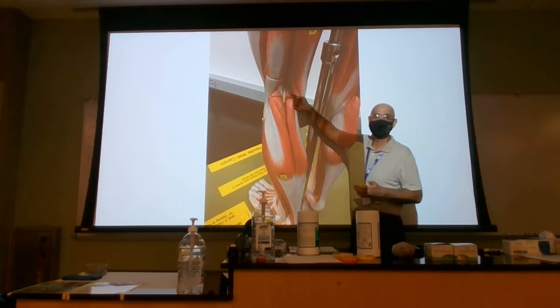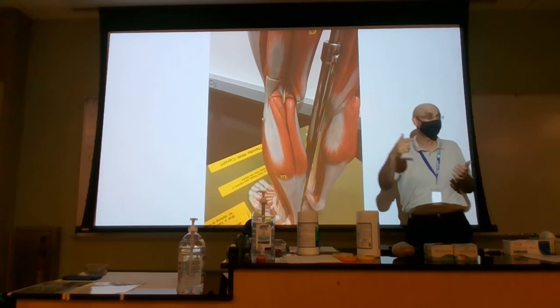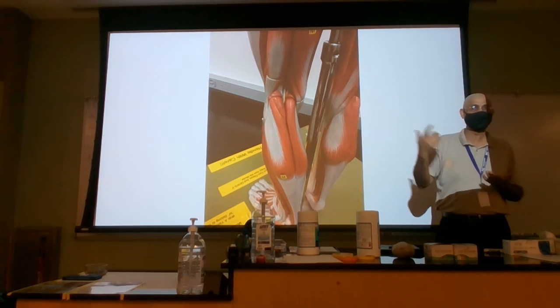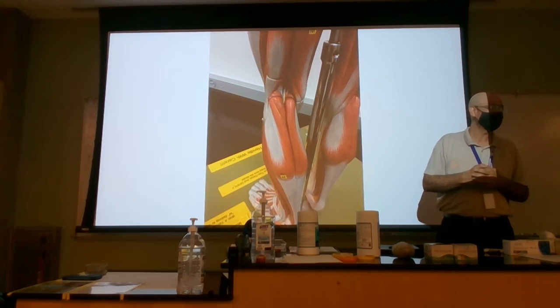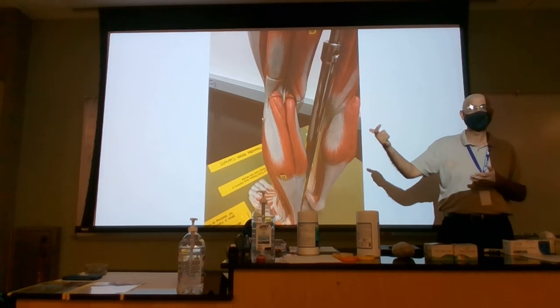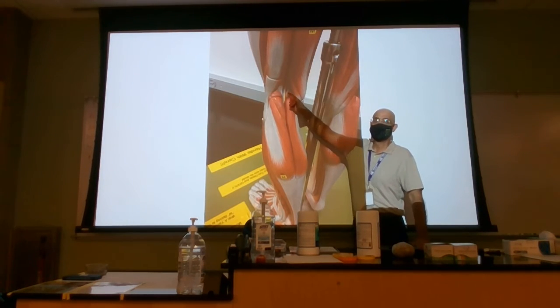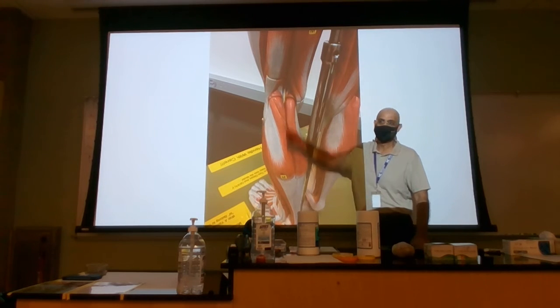So if you see the red, on the exam, if you see many colors here, it will say what is this red structure, right? It will say what it is, and I expect you to write artery or vein here, right? So this is the what? Left popliteal artery. Artery. Good job.